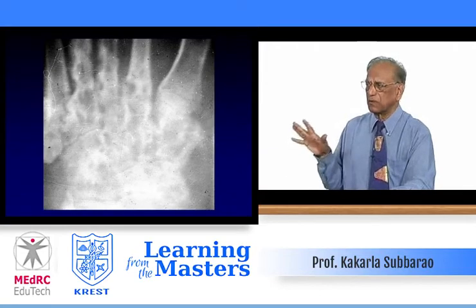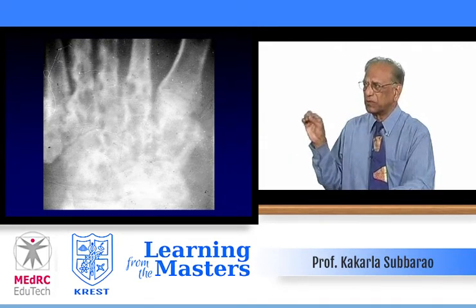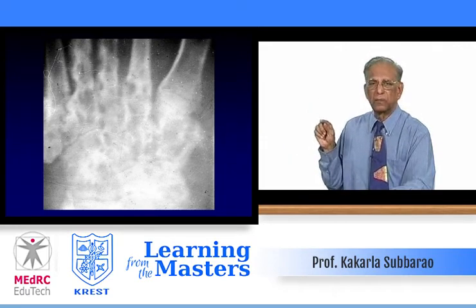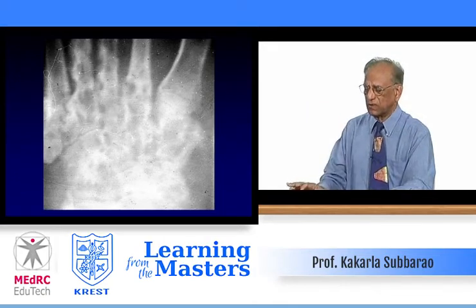Again, typical example of a fungus lesion involving the tarsus and metatarsus, multiple punched out areas with irregular periosteal type of reaction, also sclerosis surrounding these lucent areas.